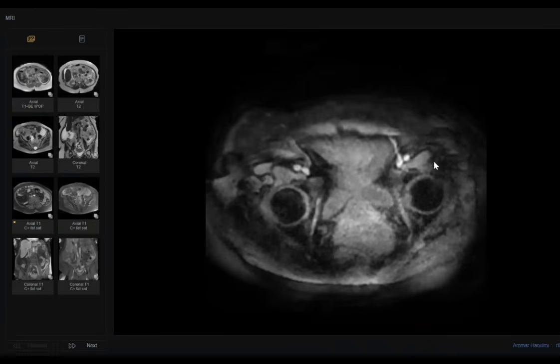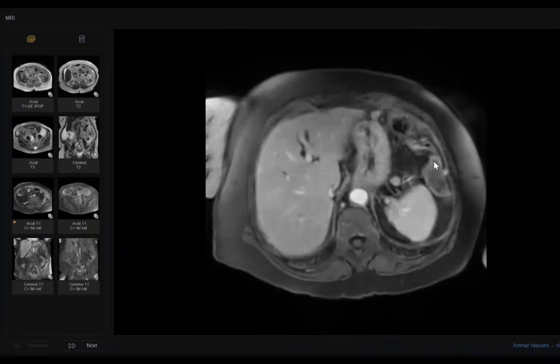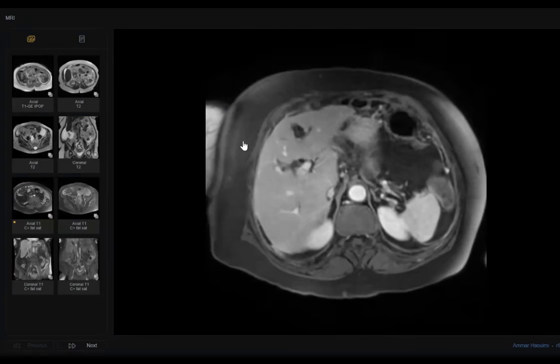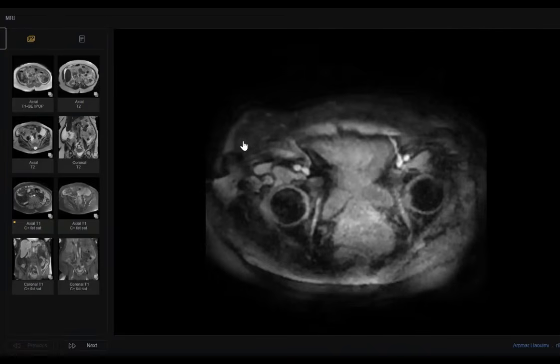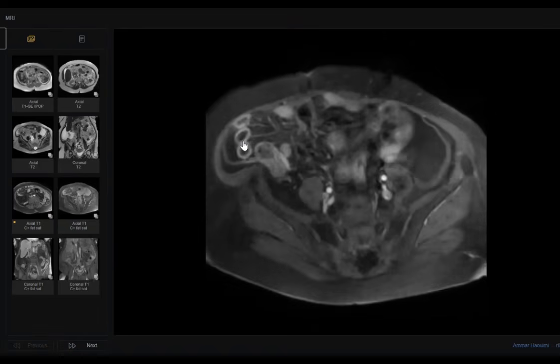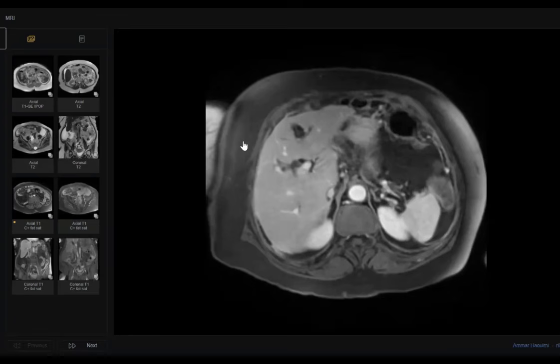Number two, I will tell the examiner I should rule out any stomach or ovarian cause, like you did very well. If the patient is female, I will go first to the ovarian location to rule out any masses, cystic masses, anything. This is normal. Second, I will rule out any stomach pathology. Like this, the examiner will be very happy.